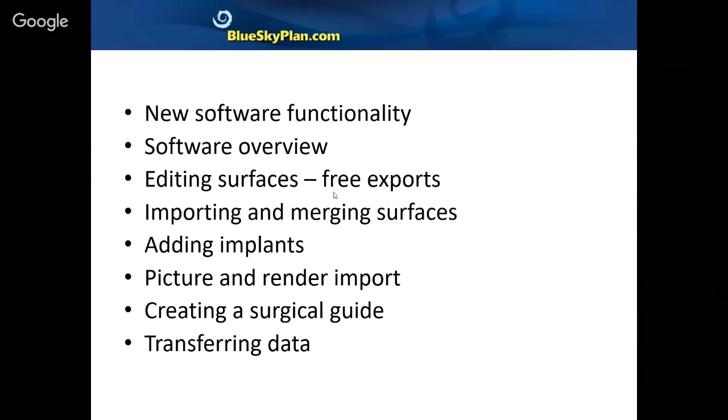The agenda for today's presentation is to go over the new software functionality that's relevant. We're going to give a brief software overview, because we did cover that in previous webinar presentations. We're going to discuss different functionality to edit surfaces. And as I mentioned, we have made that functionality free to export. So if you're inverting impressions or editing models or cutting models or converting a CT to an STL, you could use all of that functionality and you could export the surfaces from Blue Sky Plan at no cost.